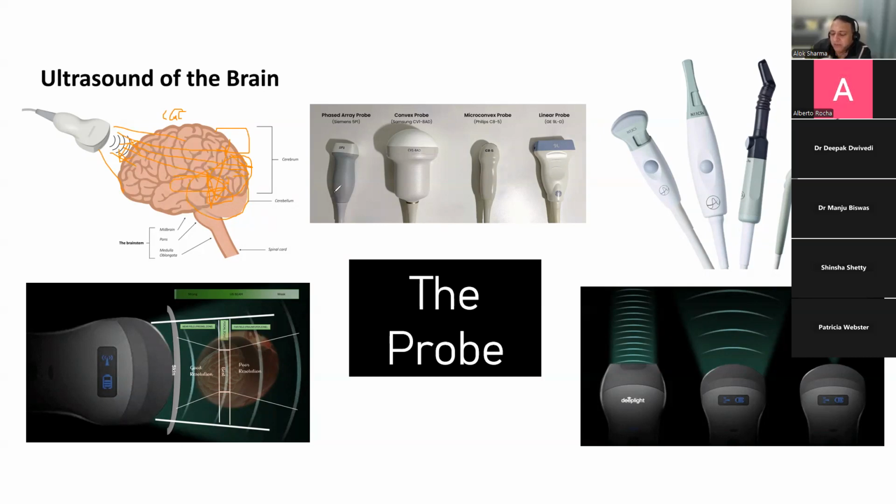I would say that if your auto gain is working nicely and it's giving you a reasonable, good quality image, just relax. If you can clinically correlate and make the decision with it, that's good enough. But clearly, if you find that there is so much darkness over here in the periventricular areas, and we'll talk about those images, that it's actually under interpreting flare, then there's a real risk that you're going to make a diagnostic error.